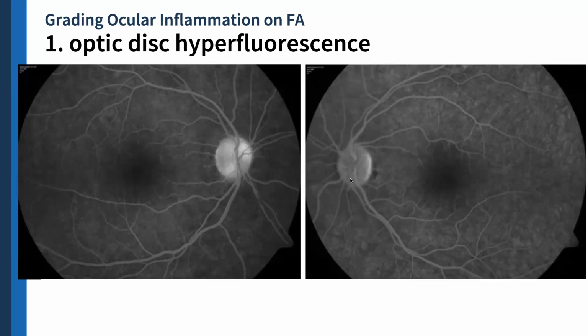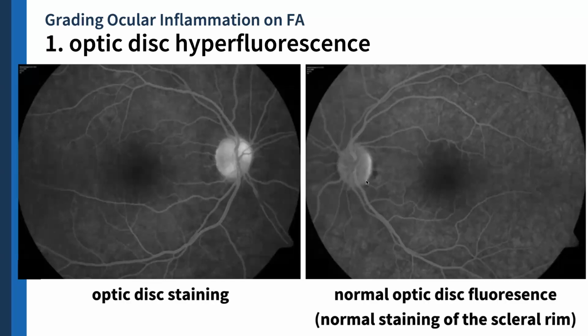So dapat at 5 to 10 minutes, fluorescein dye should have completely escaped already from the optic disc. So dapat at 5 to 10 minutes, you should be left with a gray disc. All right? So if there's parang white sa gilid, so that's usually temporal staining or staining of the scleral rim. This one is nasal stain, temporal staining, yeah.